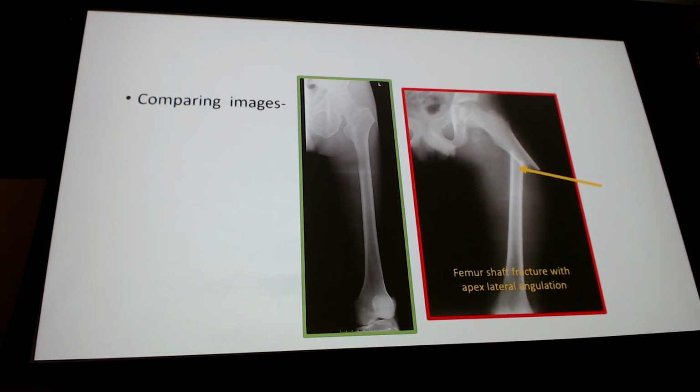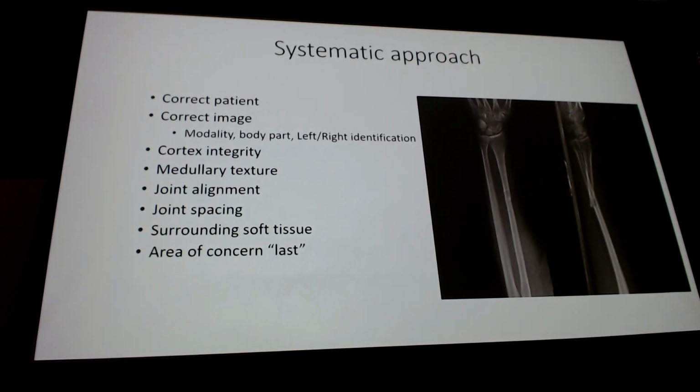Arrow sign, in case you missed it. Okay. This is just a reminder from the slides of your systematic process. Again, you don't have to do it in this order, but these are all the things in block 1 that you have to look at and look for. Okay? All the things you've got to look for. We've seen this x-ray before. You know where the abnormalities are on that one by now because you've seen it 3 or 4 times. This is that reminder. Who's ready to do some cases?